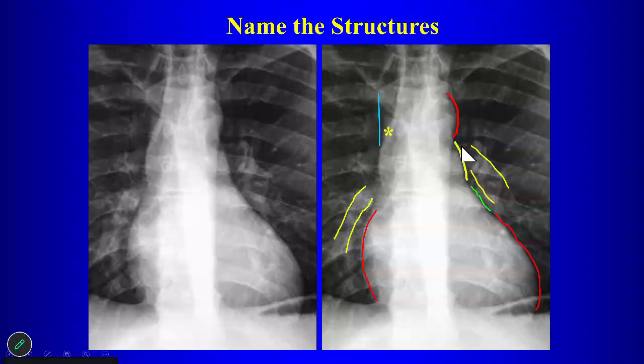On the left side, you have 3 bumps that you have to be very familiar with. These are roughly about the same size. The first bump is the aortic knob, right? The second bump. Stop mumbling. Louder. Main pulmonary artery. The last bump. That's the left atrial appendage.